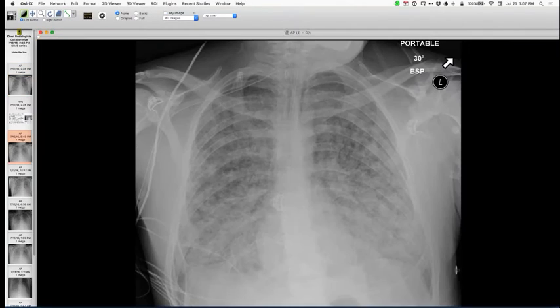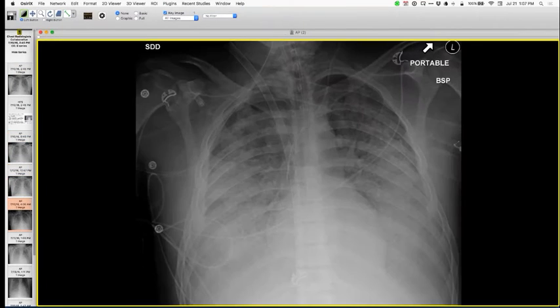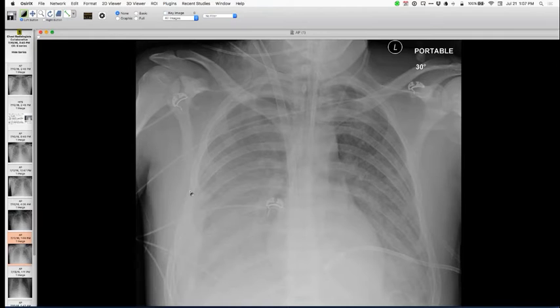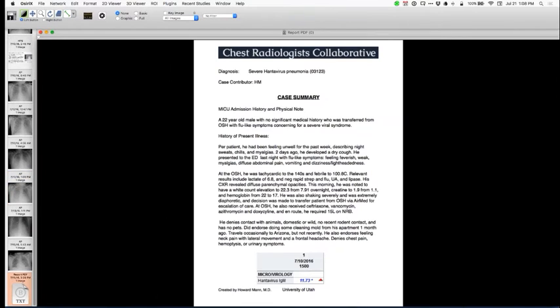So he was very sick. You can see over here he gets intubated. Very sick, he gets veno-venous ECMO. And slowly over time the opacities get better, and now we see pleural fluid accumulation, some of which was drained. And sure enough, the only thing that was positive in his evaluation was IgM and IgG. Here I'm showing IgM hantavirus antibodies. So there is the history.